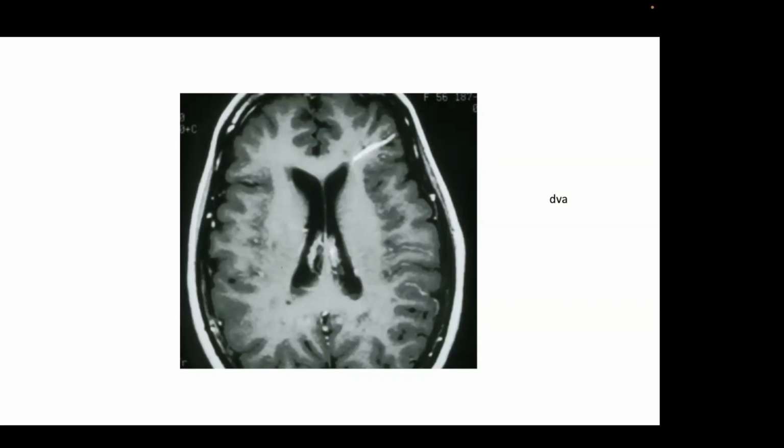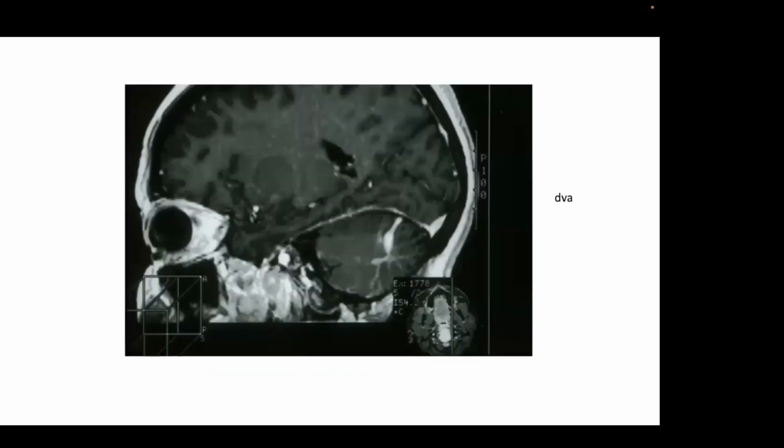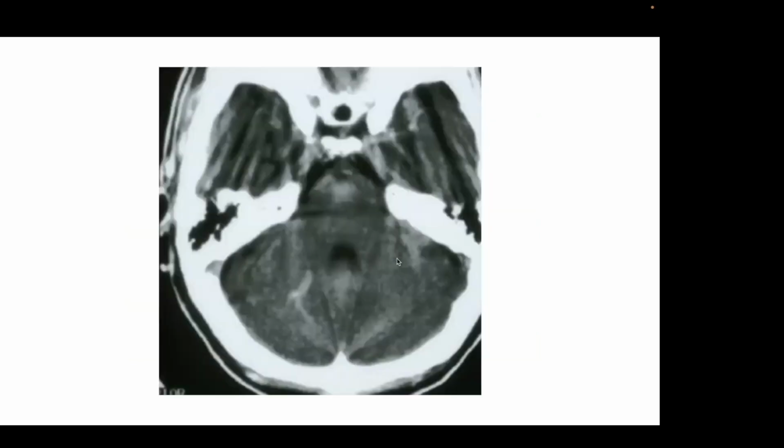The other thing you'll notice is that the draining vein on developmental venous anomalies always enhance. So we don't have enough flow velocity in the vein to give you the signal loss that we expect with an arteriovenous malformation. Here's yet another case of a developmental venous anomaly. Here you see the draining vein and the branching caput medusa in the cerebellum.